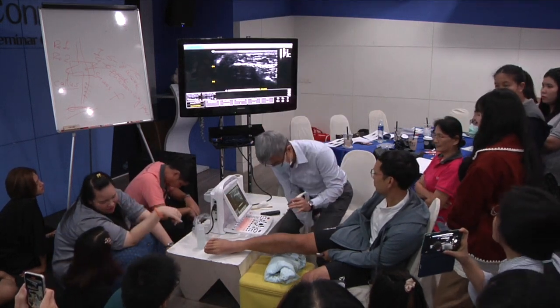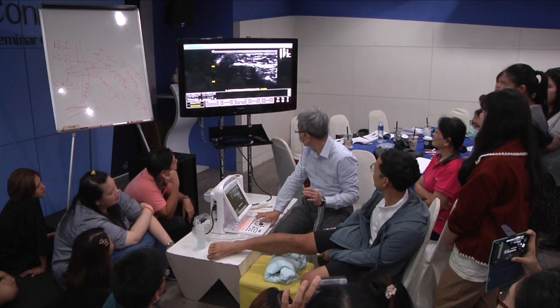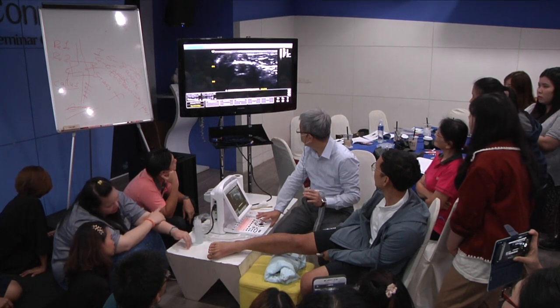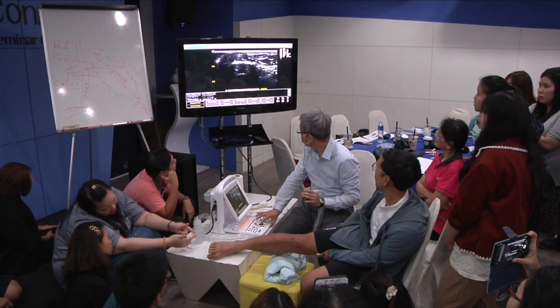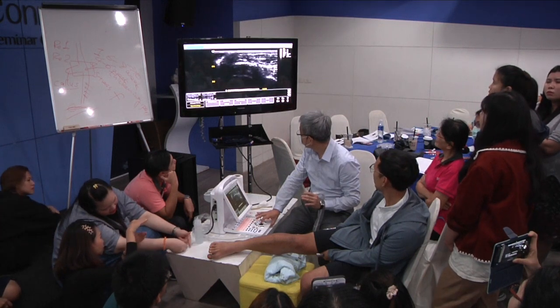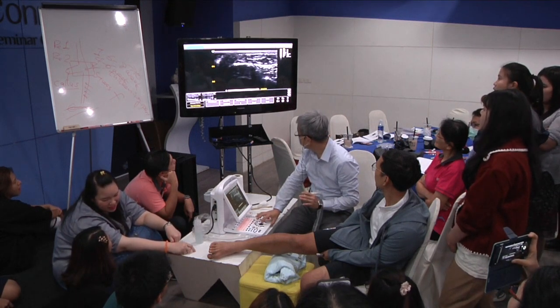Okay, let's do it again. So you like this one, right? So rotate this one. Let's rotate, then back to their positions.